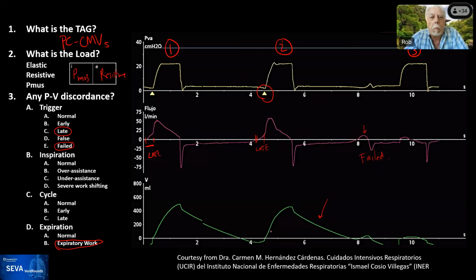It could be, yes. Although, because the patient is doing inspiratory effort, right? So that the patient has, like, expiratory excessive dynamic collapse. Well, that would be the same thing, right? I mean, that's a partial obstruction. You have a different time constant on the exhalation than on the inhalation.